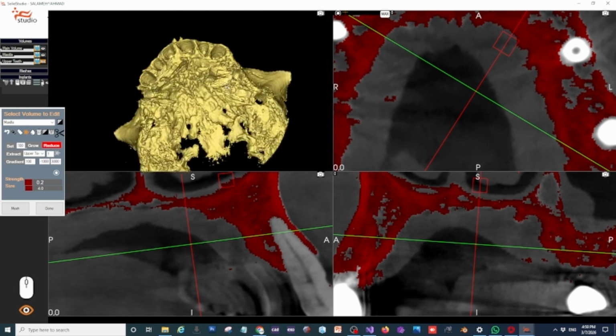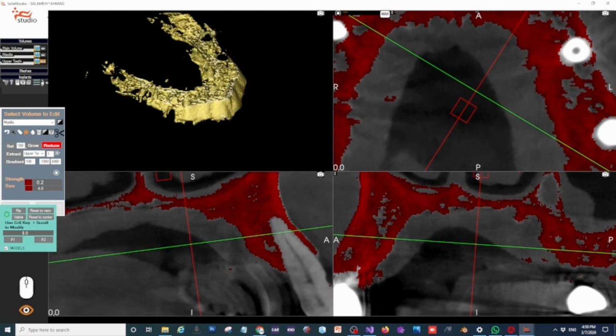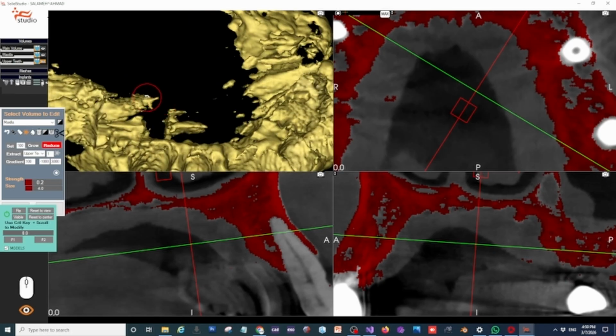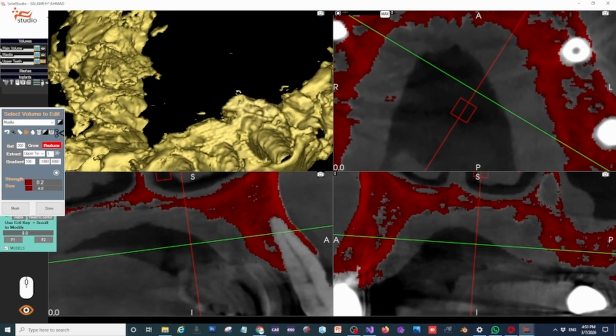To gain better access to internal structures, you can use the clipping option to isolate specific parts of the 3D volume. First, define your clip plane and click the scissors icon to open the clipping window. By setting the clip plane to an axial cut, you can hide the portions of the volume you want to protect, allowing you to apply 3D brush strokes only where they are needed.